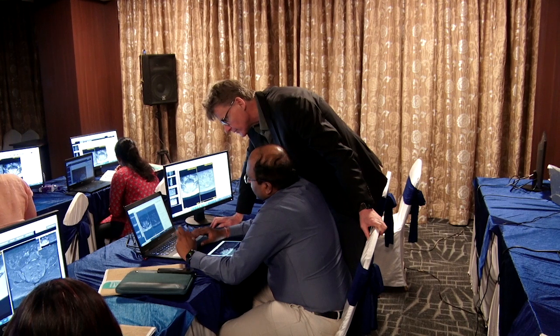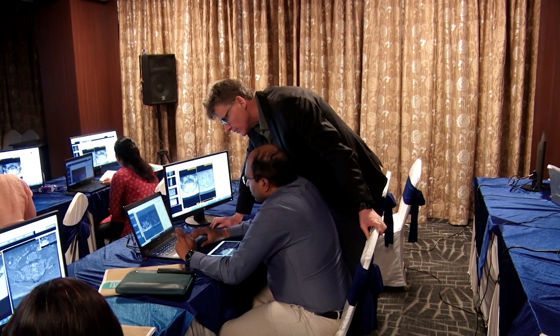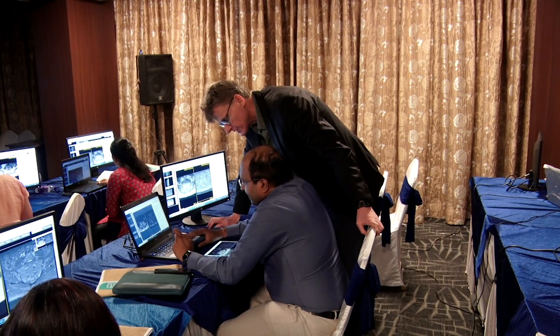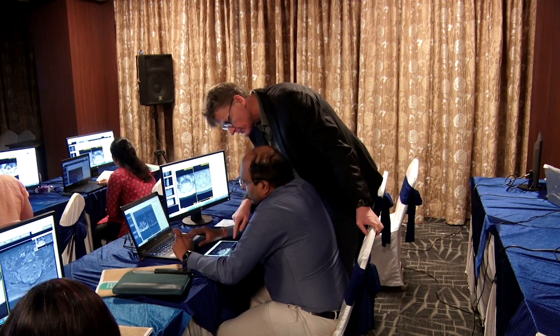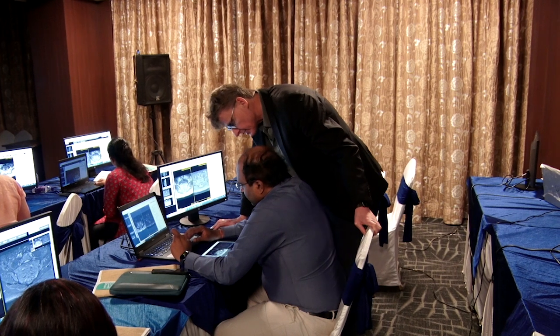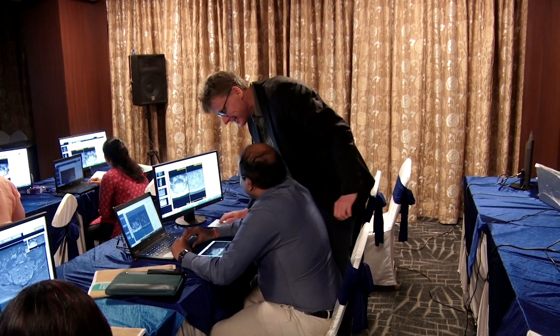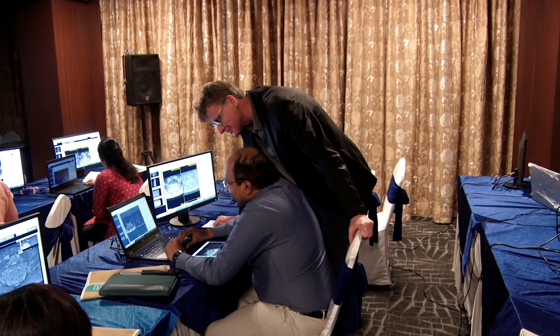Yes, it could be, for sure. But what could it also be? Is it dark gray or is it black? We actually have it twice as white. Maybe actually better. Because it's probably better than this computer. Anyway, yeah, that's good. That's actually nice. Yes.